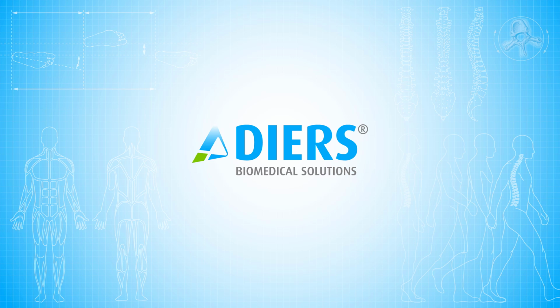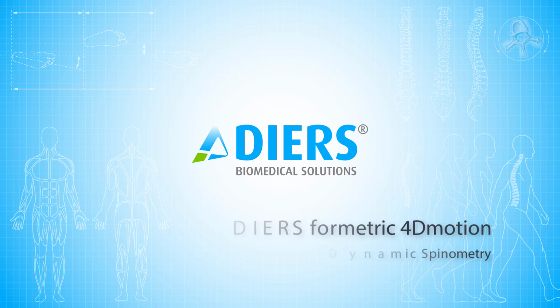Welcome to a new DIERS International online tutorial. In today's part, we cover the dynamic spine measurement with the 4D motion system.